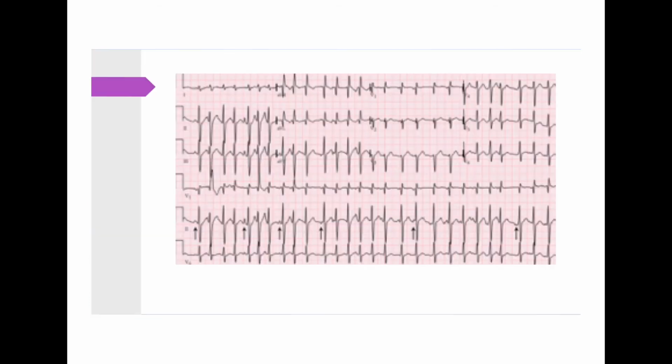Especially during this recent COVID epidemic, we've been seeing a lot of patients with this rhythm because they do have significant underlying structural lung pathology. Here's an example of multifocal atrial tachycardia.